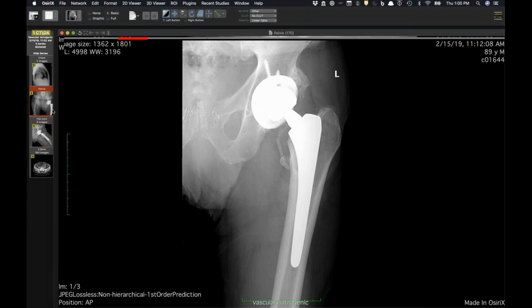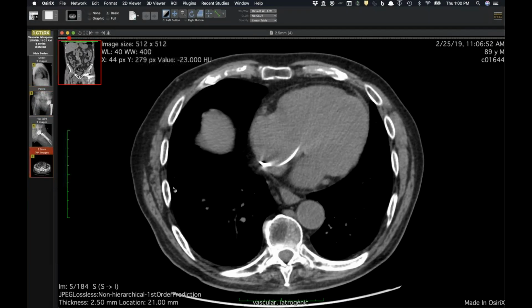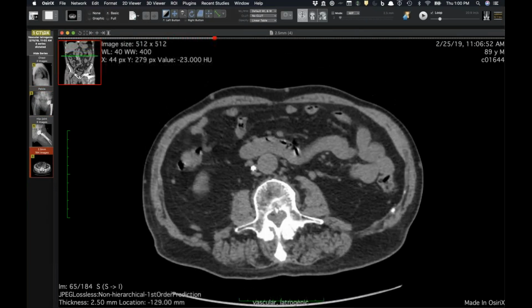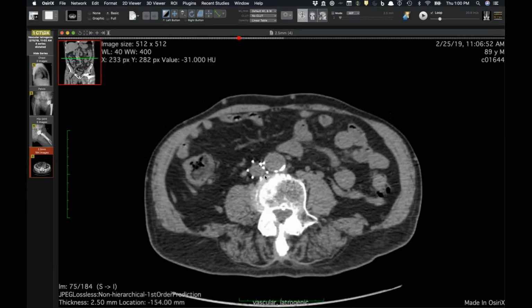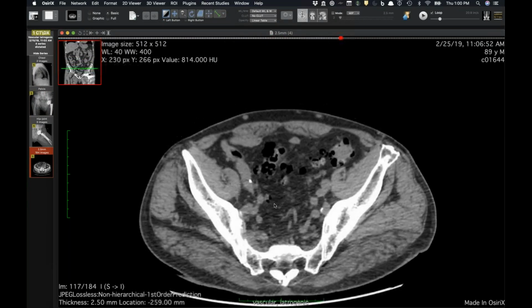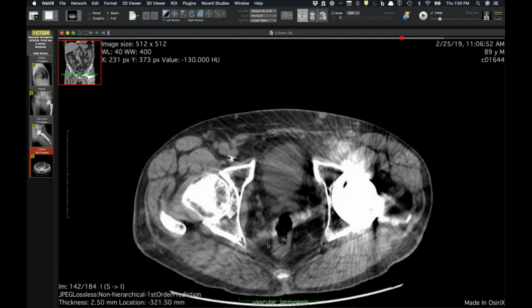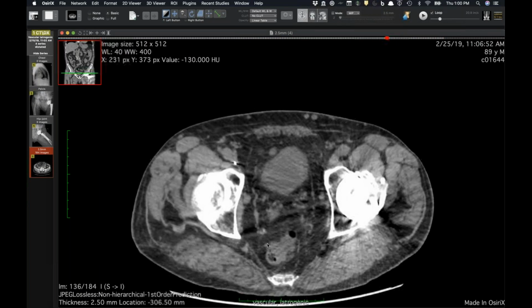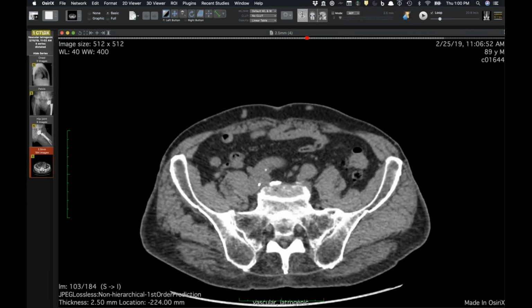He had prostate cancer. So we called up the people that had interpreted this, and the clinician said the patient didn't have any sort of catheter there, had previous catheters, and sure enough, they did a CT later and found he had an IVC filter, and it may be that the IVC filter was preventing this retained wire from migrating any further. But this was another unsuspected wire from who knows where. But just two retained wires there to finish off.